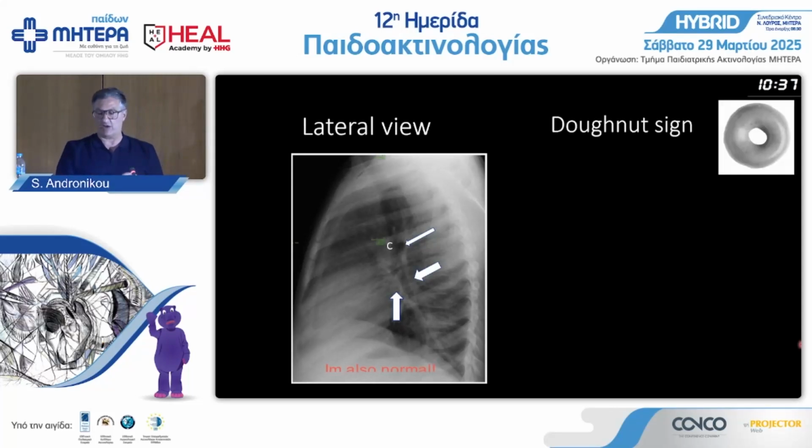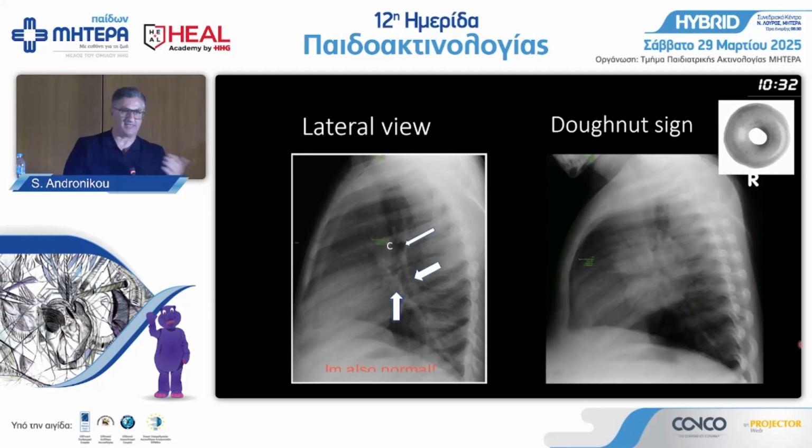So when you have lymphadenopathy, we call it the donut sign, you know, to help Americans because they eat donuts. But really, this is probably the best donut I have, so they don't all look like this. But just to show you, that's the donut. It's this bit that's important. There should be no mass there, and should be no mass behind the bronchus intermedius. All the bits on top, though, could be normal structures, okay?